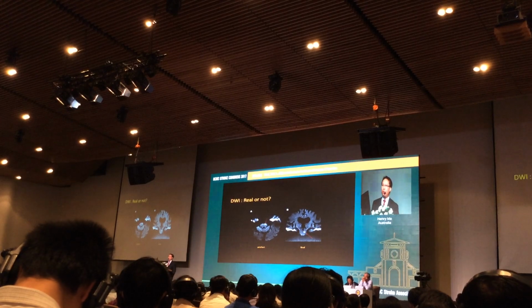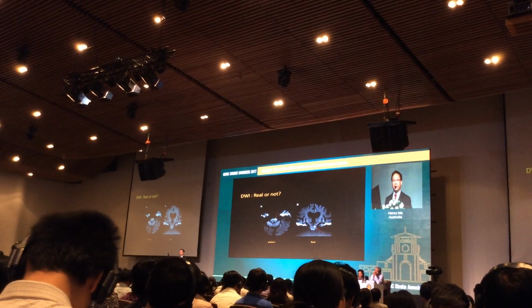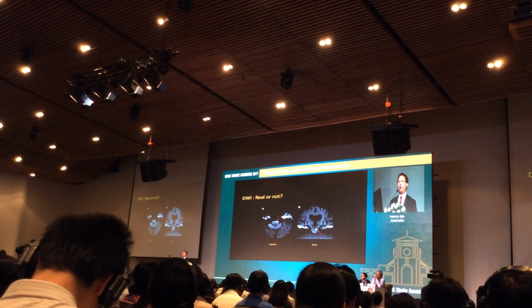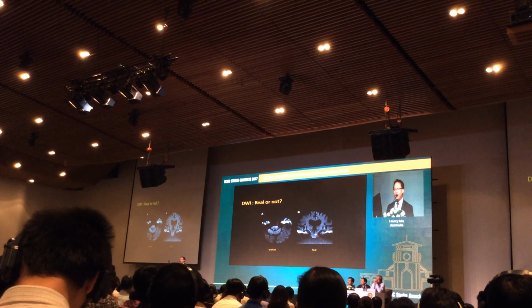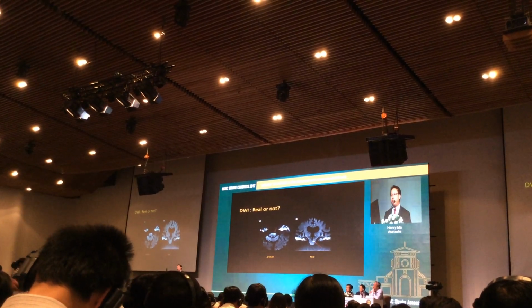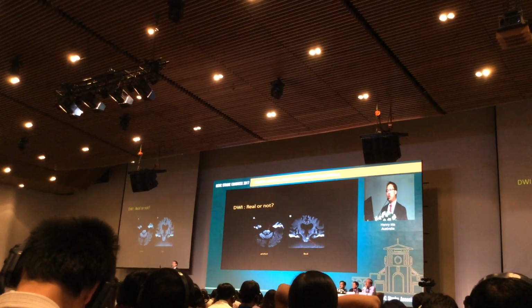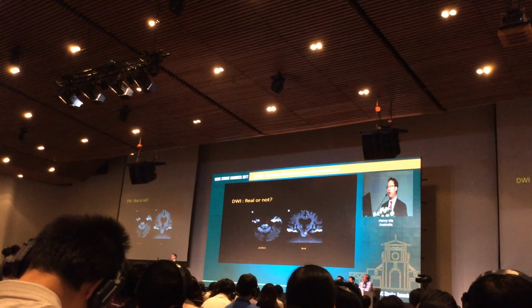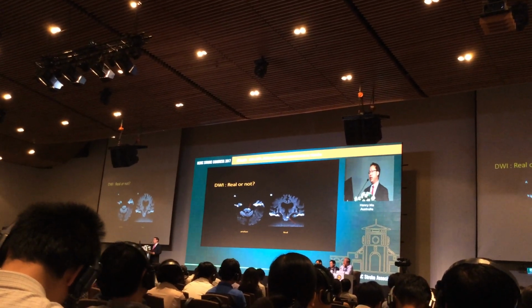And thirdly, what you see may not be all real. So on the MRI, particularly the DWI sequence, you can have a lot of bright areas that may not be real. So in picture A, the pointed little anterior lesions are actually artifacts. It's not real. But on the other hand, the one on the right is actually real. So you've got to look at the picture with the clinical scenario. Therefore, you know that lesion actually matches what you see in front of you in the patient.